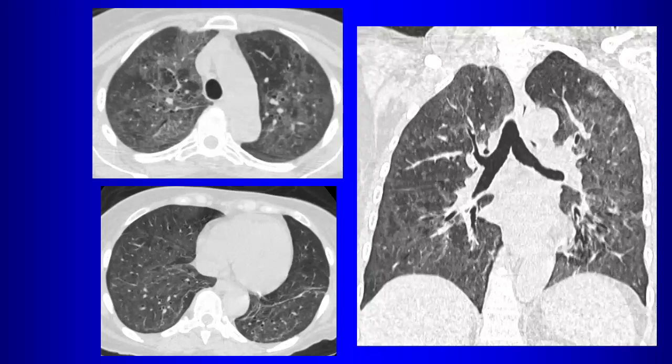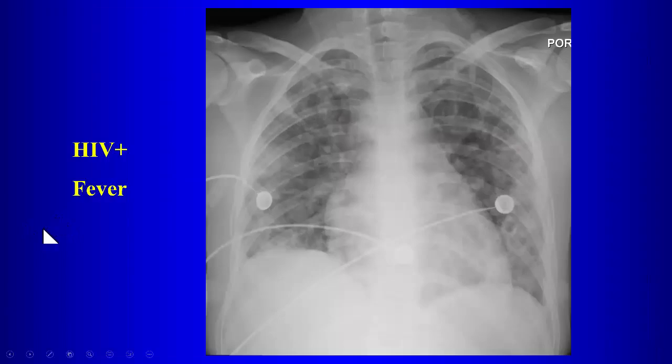Well, we don't see that too often here, but pneumocystis, right. So you would advise the ER to do what? Test for HIV. Yeah. So this was pneumocystis pneumonia. That is something you do have to consider for atypical pneumonias presenting as ground glass. Now here's a patient who's HIV positive who presents with fever, and the chest radiograph looks like this.